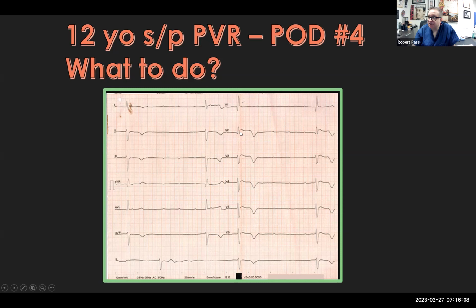It's clearly not the same as the other beats. So I think you're probably right that this is complete heart block. You would want to watch it a little longer, but probably you would not want to watch it any longer because I'm sure the patient is not hemodynamically very stable when left like this. Right. Okay, so this is a tracing you've obtained after you turned off the temporary pacemaker.